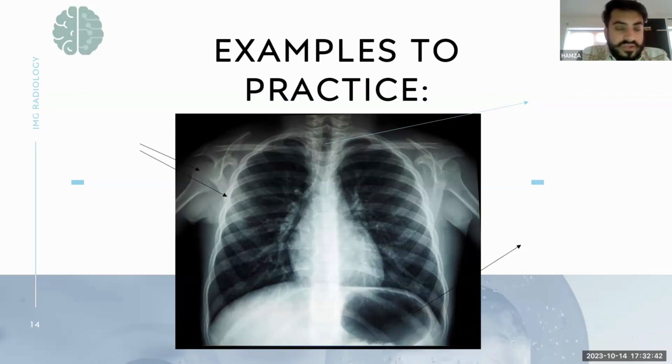Okay, yep, so it's greater density, great. So bone, as Dr. Ju said, is greater density than soft tissue. So in the right shoulder of this patient, or the left-hand side of the image that we can see, you can quite clearly see the outline of what is the humerus, and that is the proximal or the head of the humerus. Looking at that particular point of the image is useful when it comes to distinguishing fractures and dislocations as well. We'll talk a little bit more about that in the limb X-ray presentation.